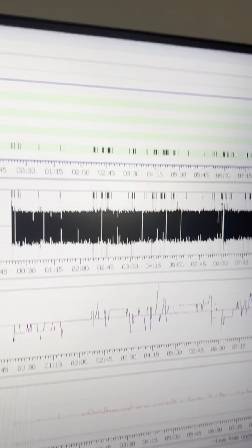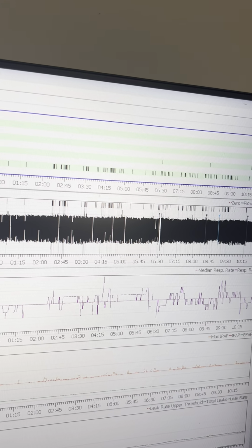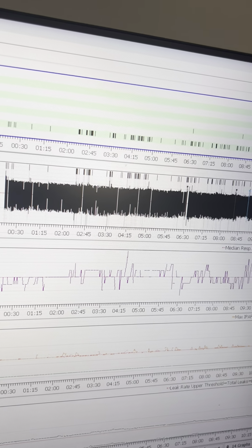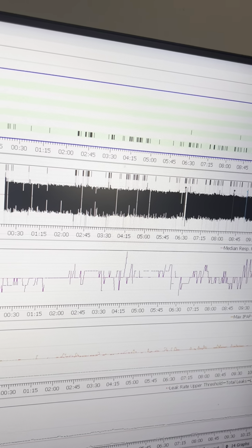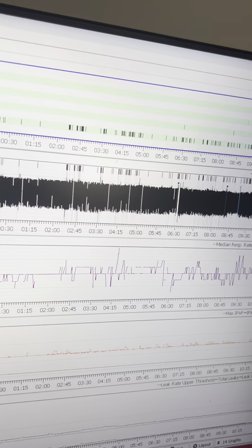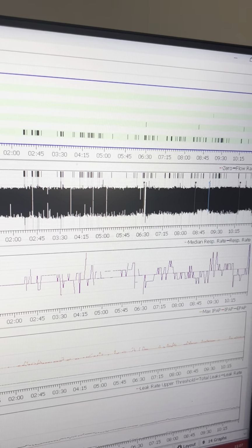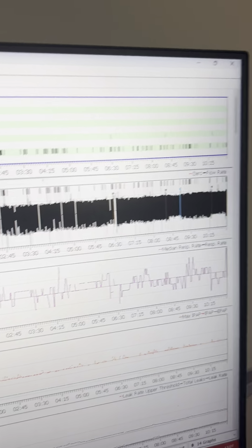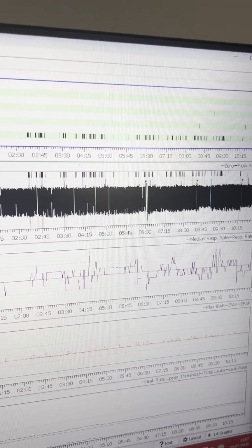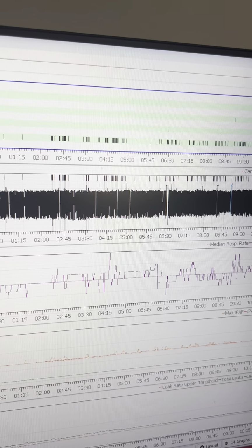I don't think you should titrate like, oh, there's still more obstructions and I have already done like 1, but I'm feeling worse. And what if I feel worse on like 1 more? Then don't up it. If you're feeling worse by upping EPAP by like 1, then already stop it and try something else. If you're feeling the same or kind of a bit bad, maybe try to go up a bit more to see what happens. But yeah, I don't know, it's just kind of weird.